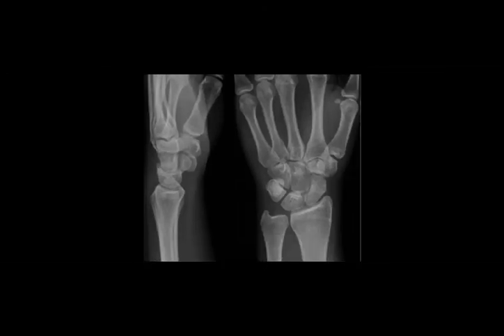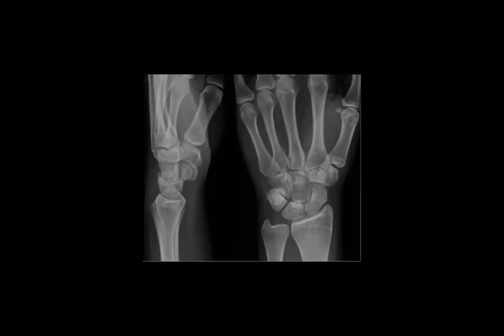What do you think about this one? When you go to the wrist, you have a checklist similar to the foot. Remember, we check for Lisfranc and stress fractures and so on.